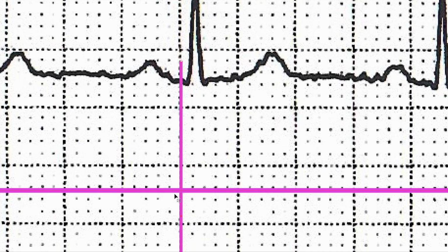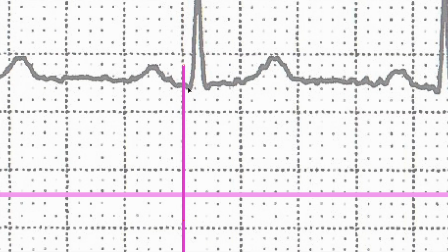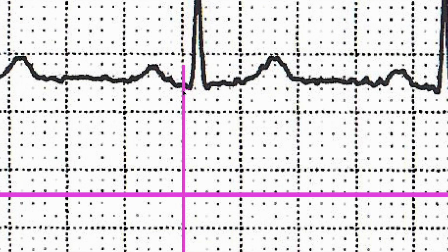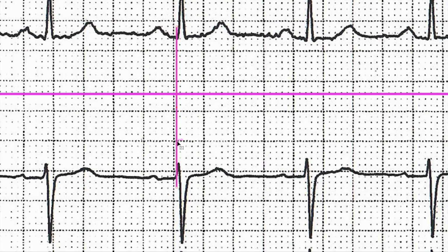When you compare that to what we were measuring earlier, look at this. There's probably a little bit of a Q wave here that I missed. I did not realize that this is actually Q going down and then the R wave going up. I went straight over here, sorry about that. Mistake. But you can correct this mistake by finding the widest QRS.